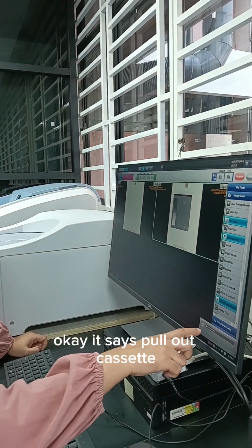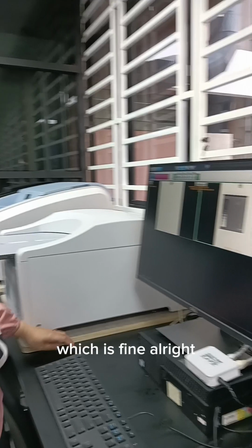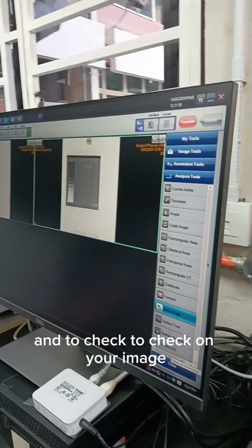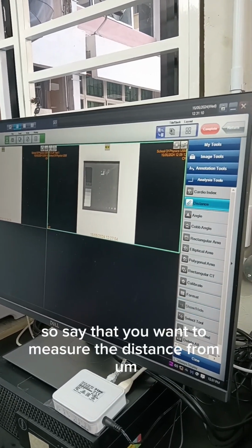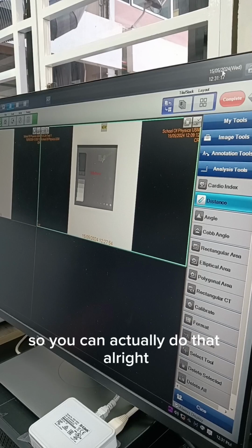Okay, it says pull out cassette, so it is ready to be pulled out. That means you can take it for another shooting, which is fine. Alright, so now that's ready. Now, say that you want to perform a simple analysis and check on your image. Say that you want to measure the distance between these two lines, for example. You can actually do that.